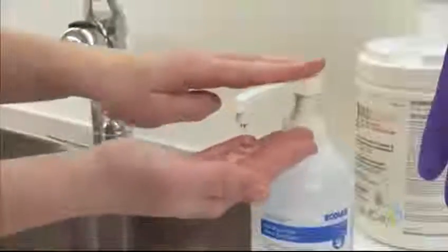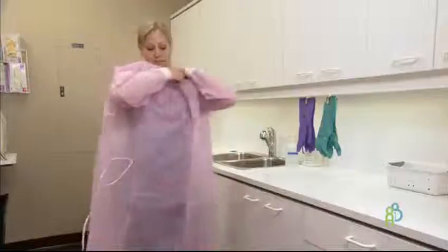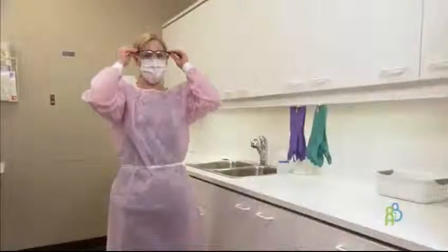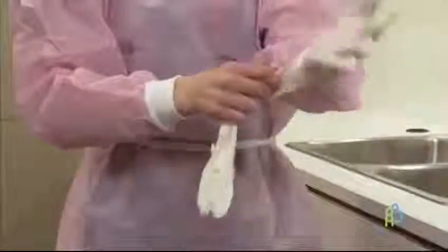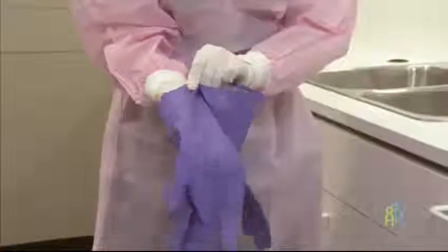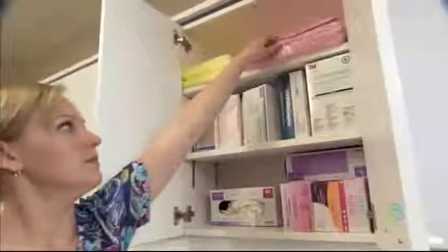Whenever involved in activities that have the potential to generate splashes or aerosols, it's important for staff to protect themselves. This is accomplished by the use of personal protective equipment, or PPE. Anyone involved in the reprocessing of dental devices should be aware of what PPE to wear during reprocessing, as well as correct procedures for putting on and removing PPE. For instance, there shall be a designated area for putting on and removing PPE. Storage of clean PPE should be in an area protected from contamination.